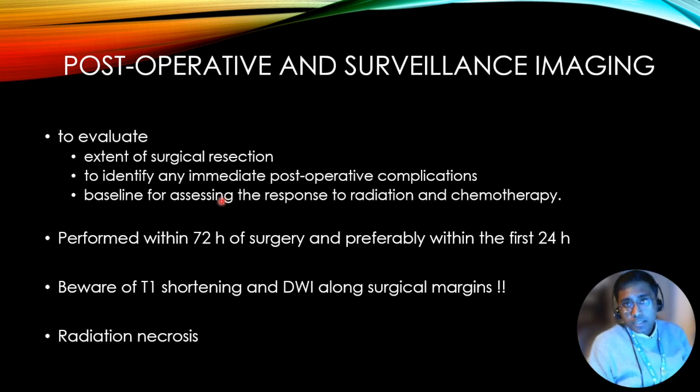Remember that after tumor resection, we can have an intraoperative MRI during the resection, or another scan immediately following the resection, within the first 72 hours of the surgery, preferably in the first 24 hours. Always look at the margins of the tumor, and if it is hyperintense on T1, make sure that we have a pre-contrast T1, because most of the time it is postoperative hemorrhage surrounding the margins of the cavity and not real post-contrast enhancement. So diffusion and pre-contrast T1 are very critical to exclude just hemorrhage surrounding the postoperative cavity, where it is very unlikely that we are going to see post-contrast enhancement.